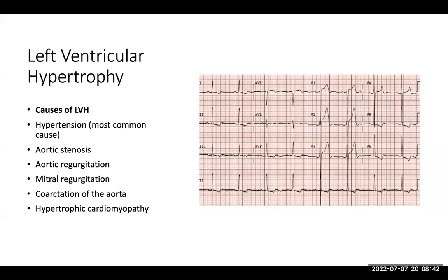There are very many other criteria, Lyon's criteria, AVR criteria, AVL criteria, but the one which is mostly used is called Sokolov criteria, and that's the one I will share with you in this slide. The most important thing to look at quickly, especially in an exam setting, is when you see these waves, V5 and V4, they are almost merging into each other. V3, V2, you can't distinguish the wave from here and the wave from here, they are crisscrossing all over. Most likely you have got left ventricular hypertrophy.